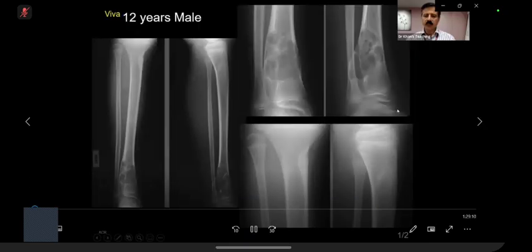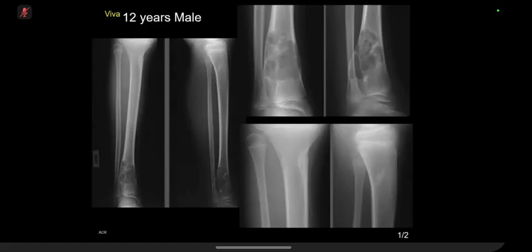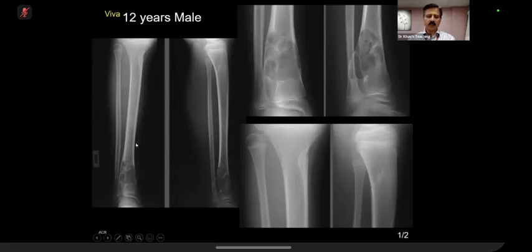Your first case, please. Okay, so I've got frontal and lateral radiographs of the tibia and fibula in a skeletally immature male. Can I guide you because of time factor? This is a poor quality film, so these are better for you. Just describe this. This is a close-up of the same thing. And this is a close-up of something which is here.